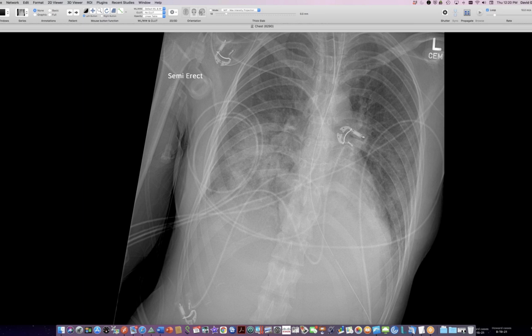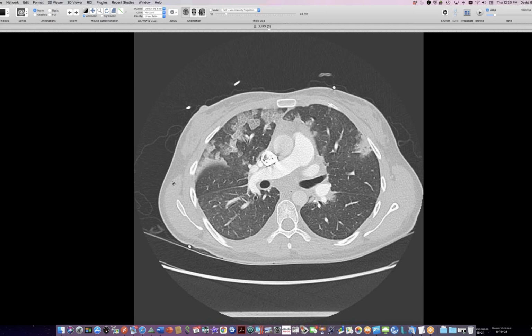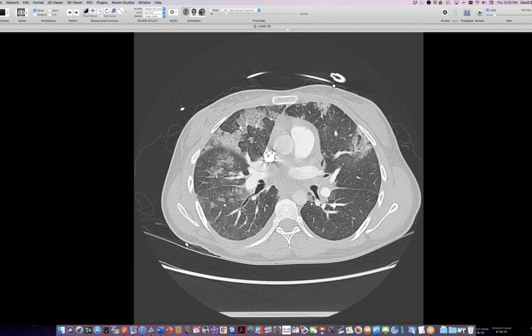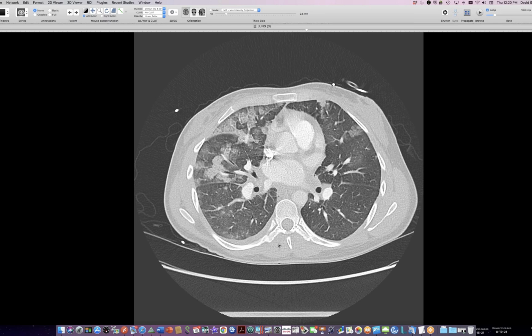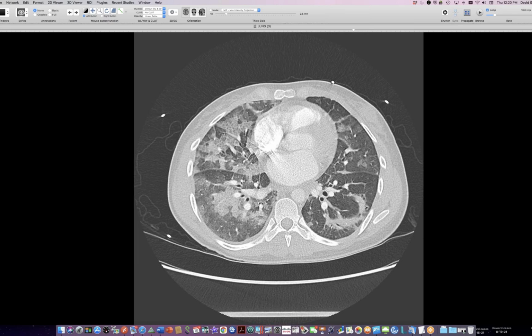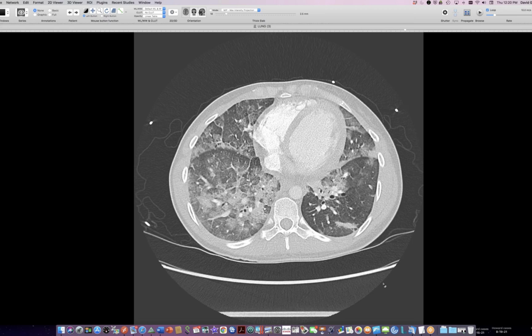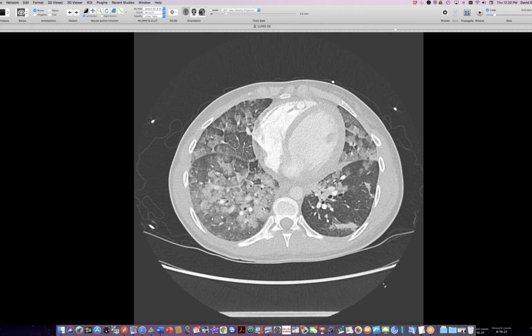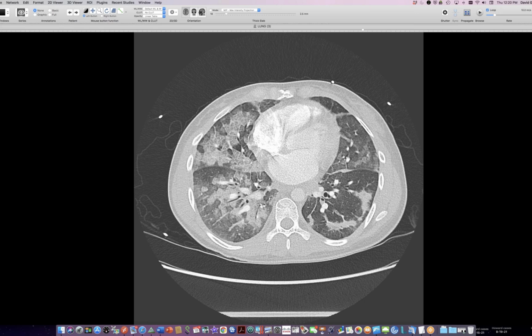So here's a CT scan at the time of this diffuse lung disease, and you'll see that there's a ton of ground glass here, and a lot of it is trying to be peripheral. It's got very nice reticulation on top of it, so a nice crazy paving pattern. And here's that lesion that we saw before in the left lower lobe. It's been re-outlined now, that its periphery has been exaggerated, so it really has that organizing pneumonia look to it. So widespread ground glass, a lot of peripheral component and organizing pneumonia component to it too.